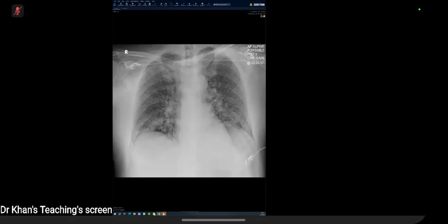So this could be a non-cardiogenic pulmonary edema. Okay. What else can it be? You described them as nodules. Let's stick with that thought, that they are bilateral nodules. It could be miliary nodules, as in metastasis or due to infectious cause. Okay. Or fungal infections also could be.